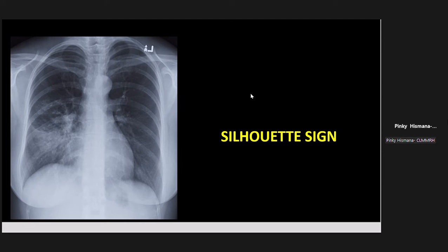Okay, infiltrates. Though some radiologists use the word infiltrates, current studies don't really advocate the use of it. Now, I'm telling you that this is a case of pneumonia because you have haziness or opacity here.